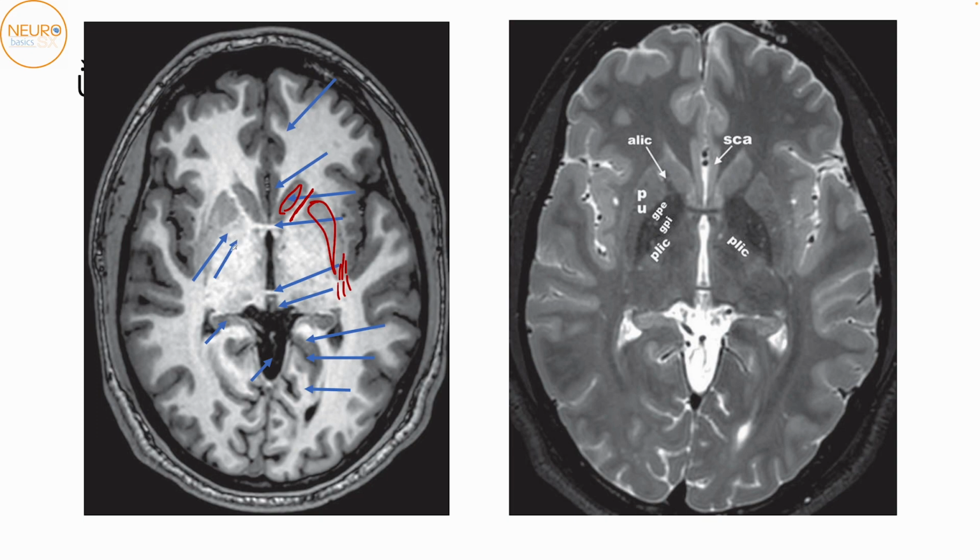There are some other less obvious gray matter structures, which are your globus pallidus interna and externa. You can see they appear more hypointense on T2. So you can see them here, the globus pallidus externa and interna. Next to them, this is the anterior limb of the internal capsule, and this will be the posterior limb of the internal capsule over here. The thalamus is not very obvious, but in the next cut, it should be. So the thalamus would form over here.